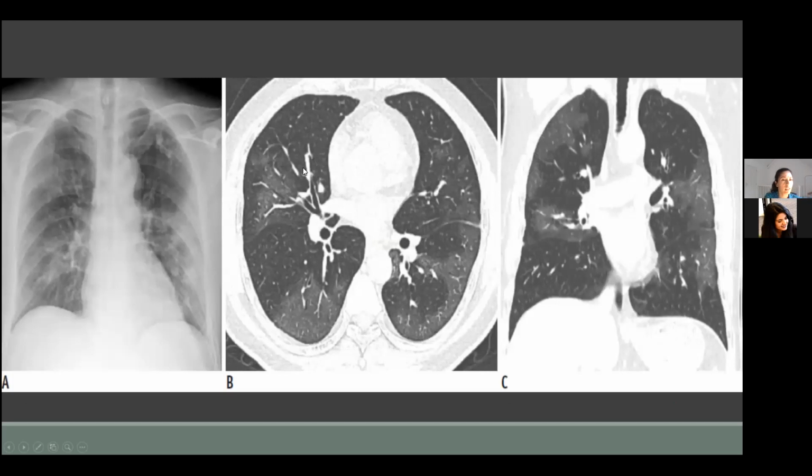So this is an example where you might be able to recognize ground glass opacities. The chest X-ray is made on the same day as the CT scan. As you can see, there is more diffuse ground glass opacities, more lobes are involved, the disease is in more quadrants, also in both lungs.